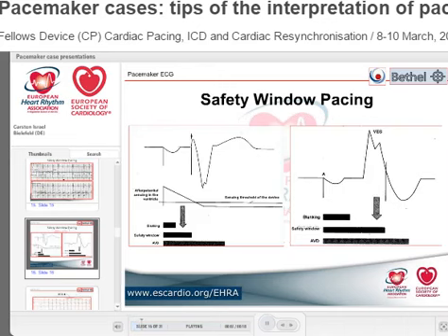And you see here, the nice thing is that this ventricular pace is never really dangerous because it will always be in a refractory phase. That is why it's so short. If you program an AV delay of 350, it could be somewhat more difficult or dangerous.